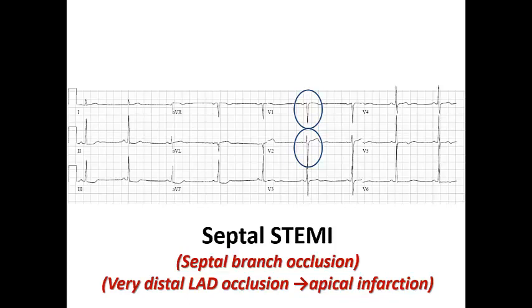So don't ignore the presence of ST elevation in V1 and V2 in a patient presenting with chest pain, even if it is not fulfilling the full-blown criteria, because it is a start of infarction.